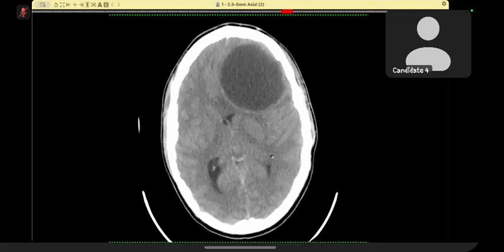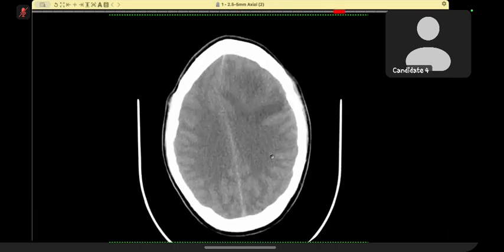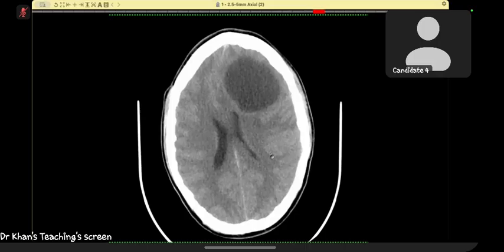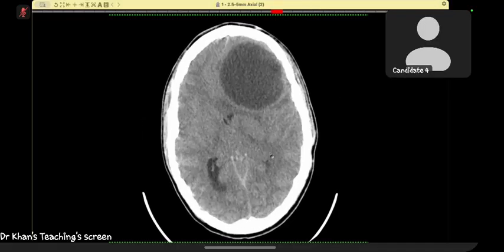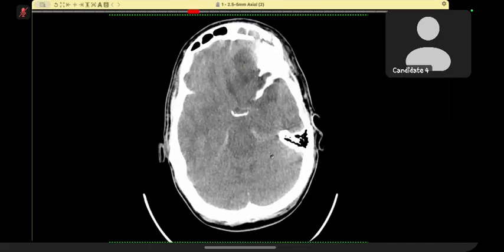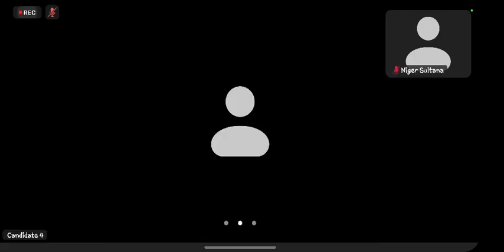Okay, I am presented with the CT brain non-contrast images of an 18-year-old patient who presented through emergency with a history of fever. I can appreciate a well-defined intra-axial cystic lesion with some debris-type contents within the left frontal lobe. It is causing subfalcine herniation and there is associated edema. It is causing significant mass effect over the frontal horn of the left ventricle. I am looking at the rest of the brain parenchyma. No other similar lesion is appreciated. As the patient has a history of fever, I would like to see the post-contrast images to see any peripheral post-contrast enhancement in this area.